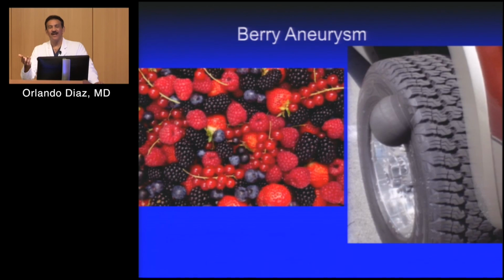So now it's a lot of MRI sequences. If we have perfusion sequences versus diffusion, remember Dr. Jackson said diffusion detects the stroke, the infarct. If we have an MRI with a diffusion and it's bright, we know this patient has an infarct already. That part is dead. If we know what is hypoperfused, but is not diffusion positive, the difference is hypoperfused or penumbra. But still, we need to waste time doing it, but it's worth it.